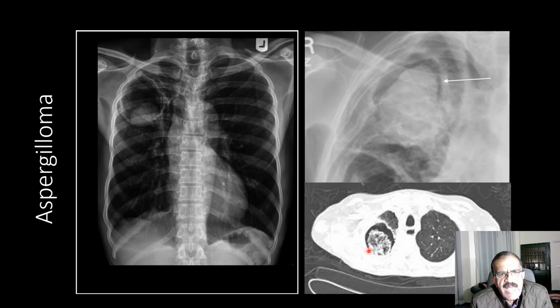Of course, in any opacity, X-ray only shows you the shadows. X-ray doesn't show you the actual pathologies, and you have to draw inferences from the appearance of the opacity and the secondary effects. Ultimately, correlating these opacities with the clinical condition gives you a better diagnosis. And many times you need to do further tests also.